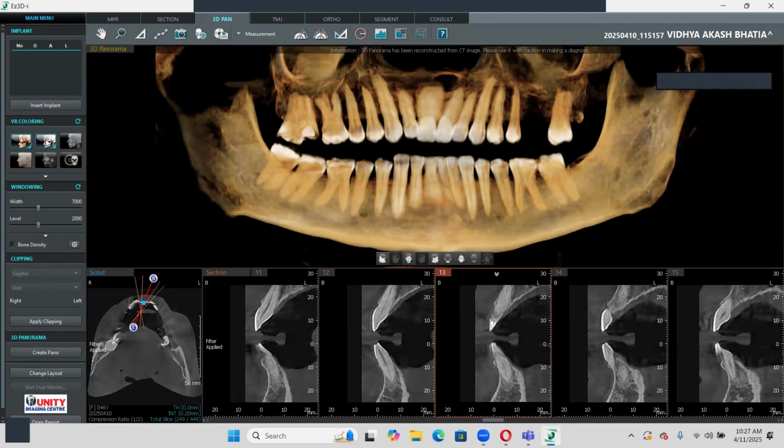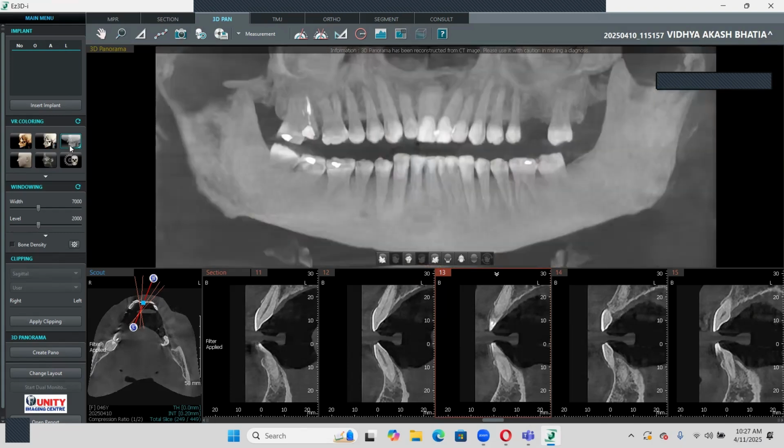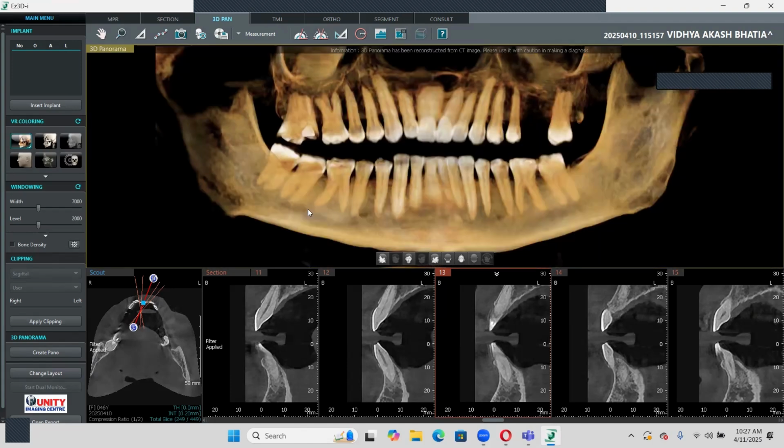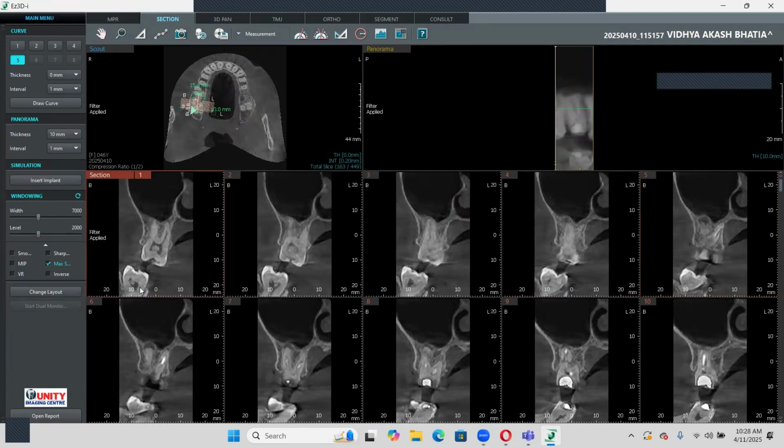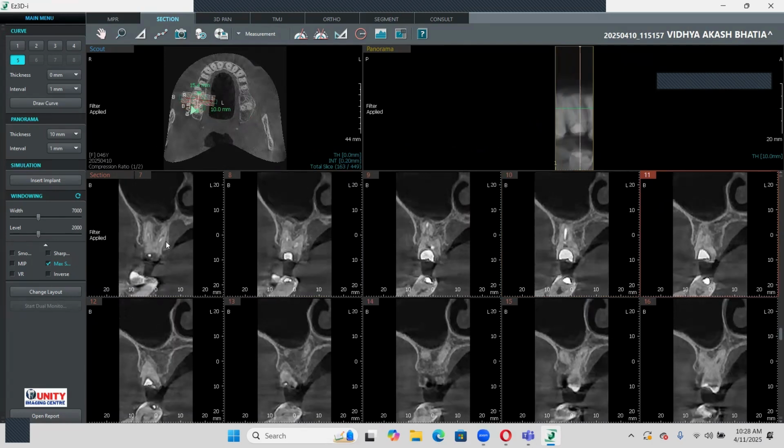We can change it again, just like that 3D thing. This view looks good for people who are used to looking at X-rays. So for doctors, I send this. For patients, this one. But still, in concluding a diagnosis, they are not helpful. For concluding a diagnosis, you always have to see the slices, to see the PDL, to see the continuity of the PDL ligament, bone loss.